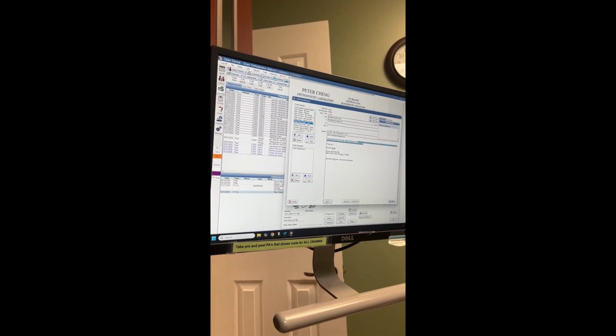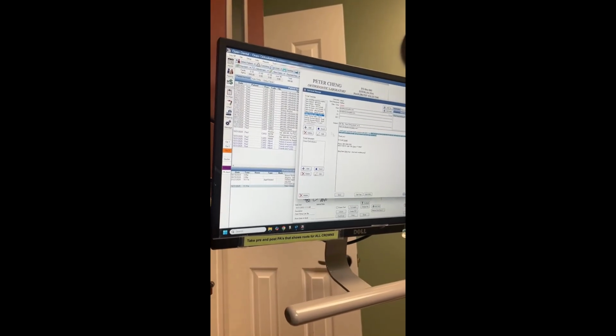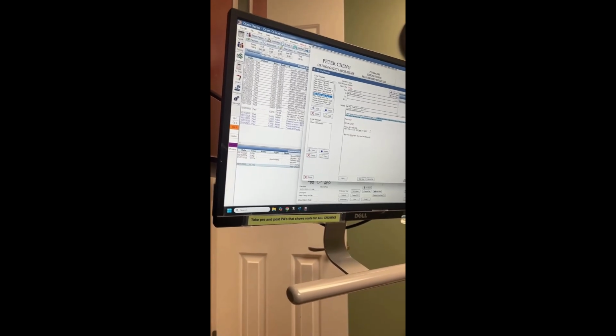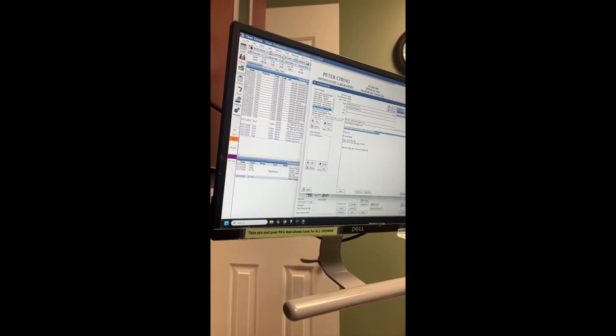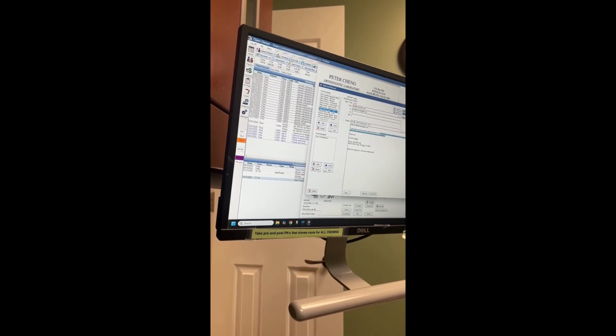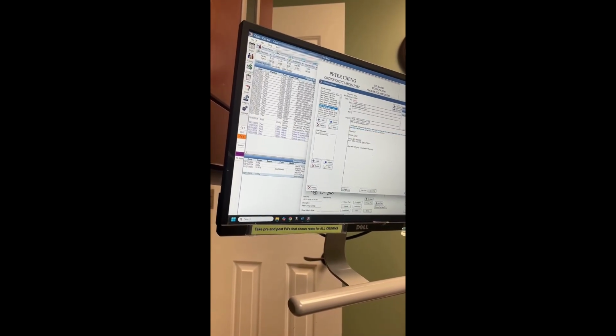So I'll just say that for now, but basically we'll upload one of the STL files to each email, and then we'll send 2 different emails. Because most emails can only carry like 25 megabytes or something, and most of these scans are like 15, just over it. So we send those out, and then they manufacture it, and they mail it to us, and then we're good. Sweet.